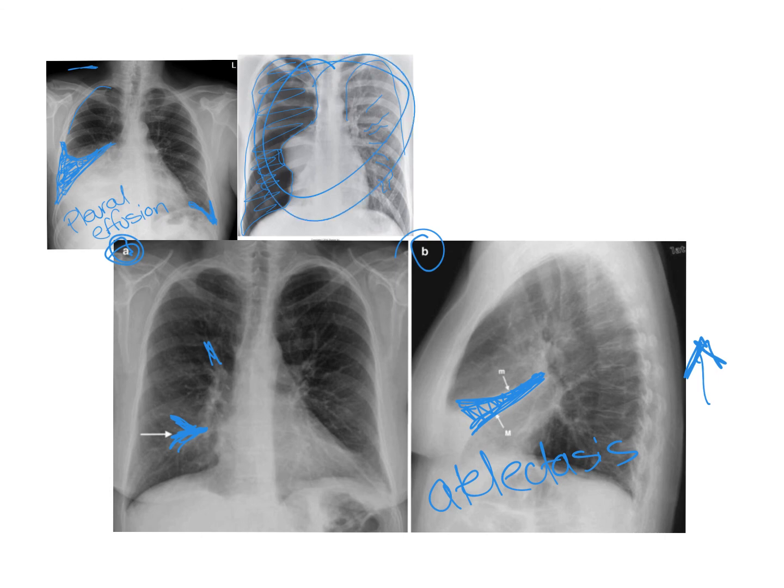atelectasis confused because they're both technically considered a collapsed lung. One thing to note, though, is that atelectasis is an increased and additive disease because it adds in certain things. Fluid, more compactness, it adds abnormal tissues, basically, for lack of a better word right now, into the lung field. Whereas pneumothorax, also a collapsed lung, is collapsed due to the abnormal presence of air in that pleural cavity.